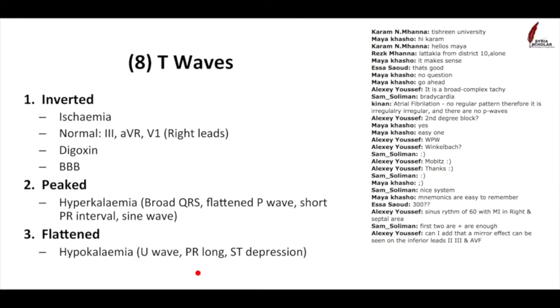So we're coming pretty much to the end now. One last thing to look at and then we're done, which is just the T waves, and we actually saw a lot of them in those two slides we just looked at with the heart attacks. T waves should always be pointing upwards, like a nice normal T wave. If you get an inverted T wave, that can mean a few things, but it tends to mean ischemia. So it tends to happen in things like a heart attack or not enough blood getting to the heart.